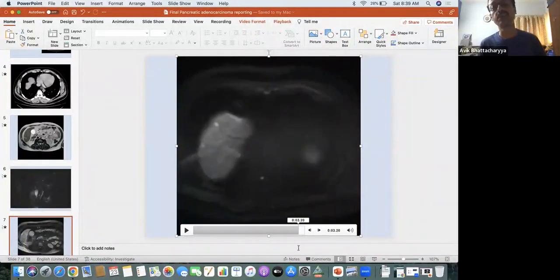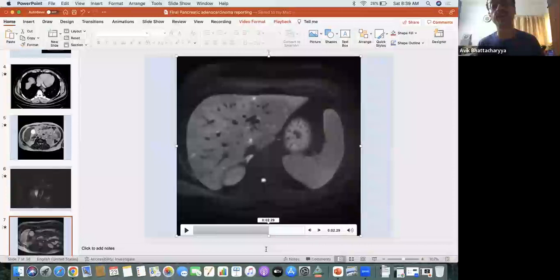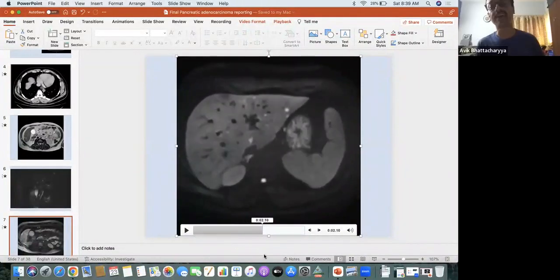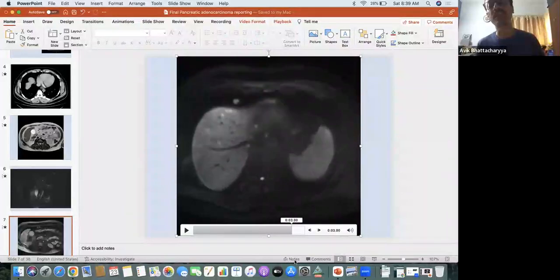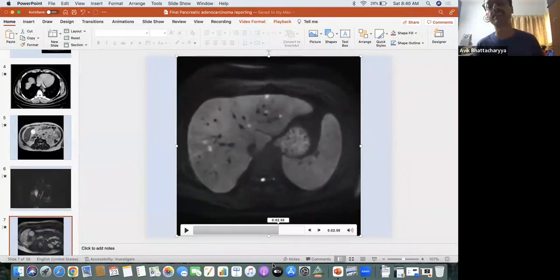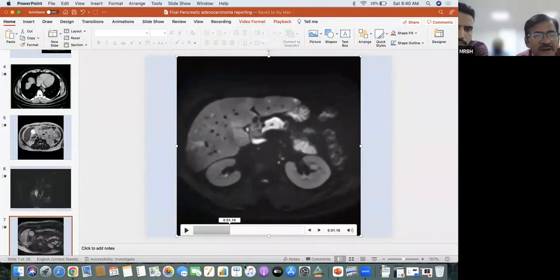We could see on CT scan probably 2 or 3, on MRI T2 images 4 and 5. But on diffusion, how to differentiate abscess versus metastasis? Sir, that's why. So these all are diffusion restricted, right? These all are bright. Bright means you can see now the liver is looking like multiple small light bulbs are popping up inside the liver. Yes.